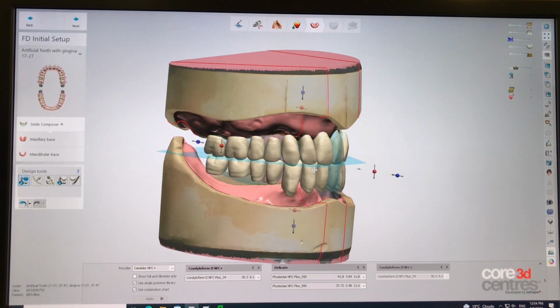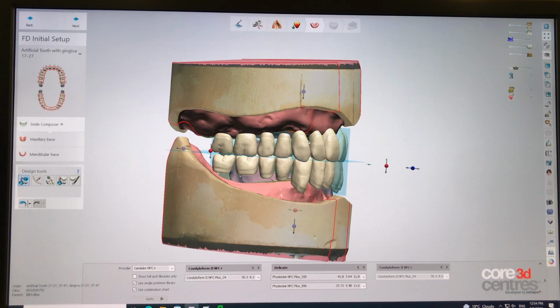So everything changed accordingly. The problem is, with this mold, which is the smallest one, this canine line, is it over the middle of the canine? Doesn't look like it. So possibly, if I were to select the one bigger and apply, there.